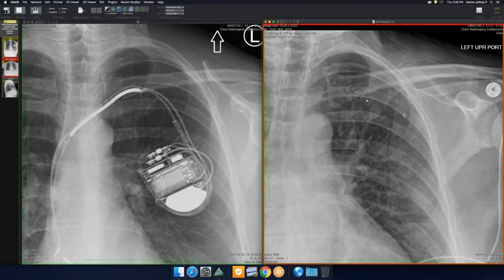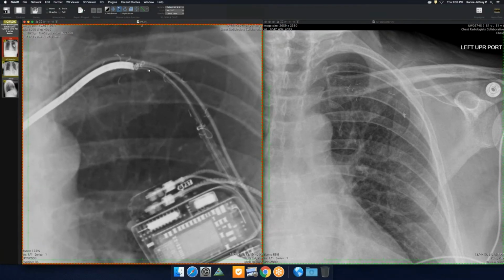But it's right where you typically can see lead failure. And if you look carefully, there's actually a little fracture right here as well. It kind of gets a nutcracker effect between the first rib and clavicle. And there's motion there, whereas this is relatively fixed other than moving with the chest wall. And this, of course, is intravenous. But I've seen a break, but I don't think I've ever seen one start fragmenting like this.